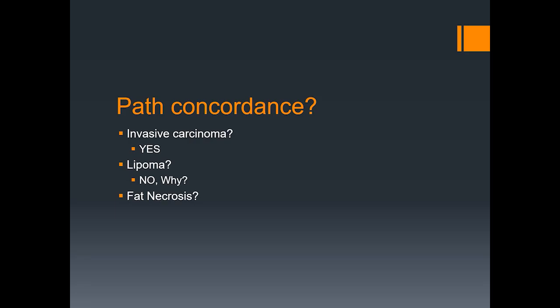Fat necrosis. I certainly think that this has imaging characteristics consistent with fat necrosis. It's a new, subtle finding. It's difficult to see in all views. And then the ultrasound characteristics are fairly consistent with fat necrosis. And this would be in your differential diagnosis for RAD-path concordance. How about benign breast tissue? And the reason I would say no is, again, we have to make sure that we see the lesion. If we have purely benign breast tissue, we have to consider, have we adequately biopsied and assessed this lesion?